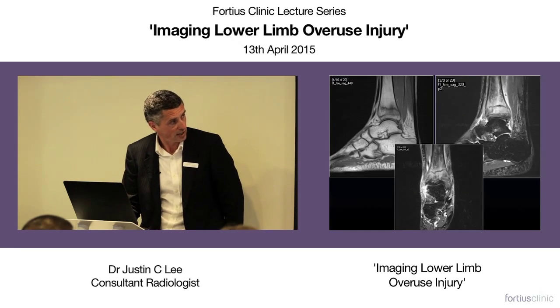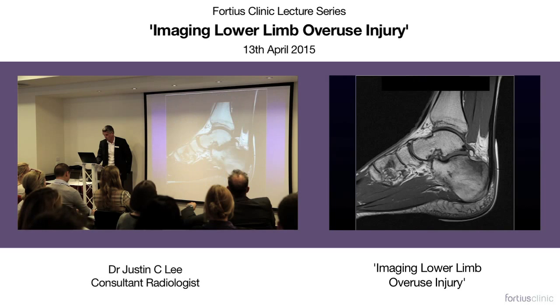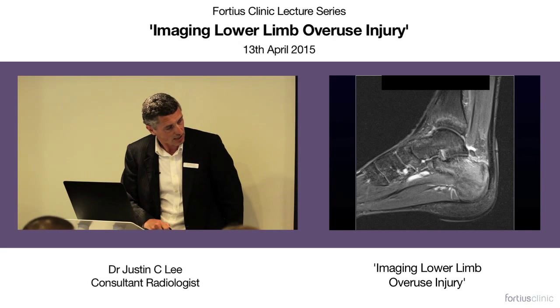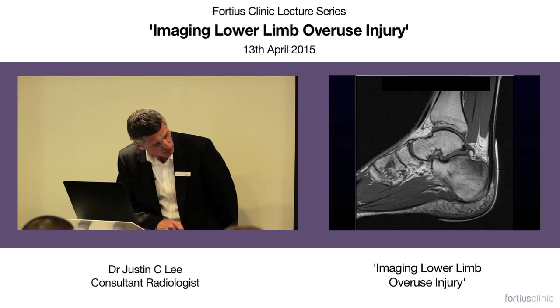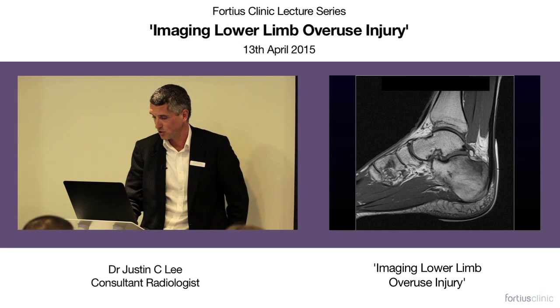And then you do the MRI, and it's absolutely barn door. So again, the anatomical sequence, pathological sequence, and another pathological sequence. So that's distal tibia, that's common in runners. Now, this doesn't show too well, but the os calcis is obviously a common site for a stress fracture. This is the typical location of a calcaneal stress fracture. They parallel the posterior cortex, and they're coronally orientated on imaging.